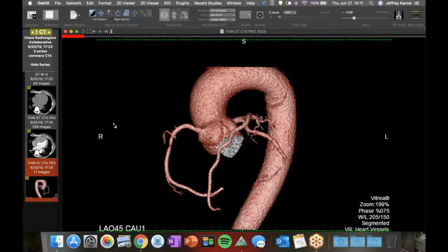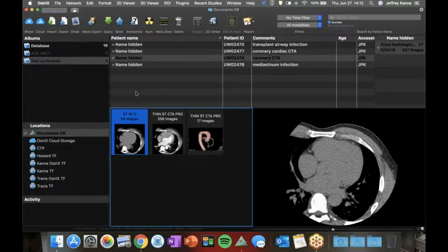Interestingly, he ended up having a cath that didn't show any significant stenosis at this area, and had an echo that was normal, so was discharged on medical management. One of the things we're starting to do selectively here is fractional flow reserve, and I will show a case. So it's possible that this case may have saved an admission and a cath by doing FFR.